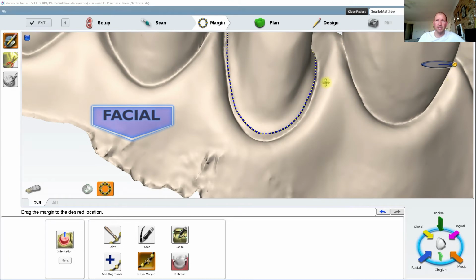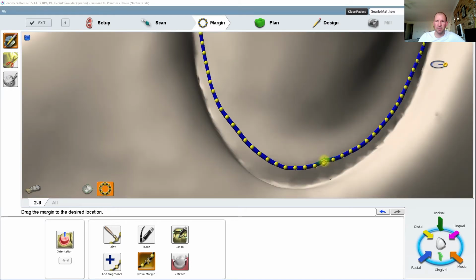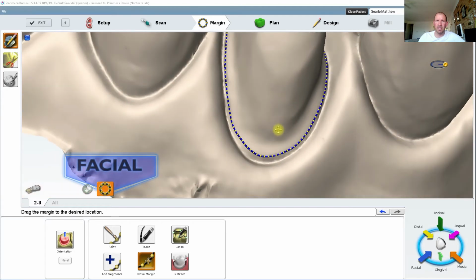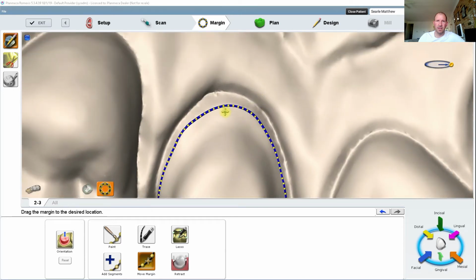Depending on how large this is will depend on how much adjustment there is in your margin movement. So you make that smaller, the smallest it can be. You can see we're just moving a very small section at a time. If you go larger, obviously, it will try and find the sharper edges for you. Now this mouse is a particularly touchy gaming mouse, so generally most mice that people are using are not as touchy as this one.